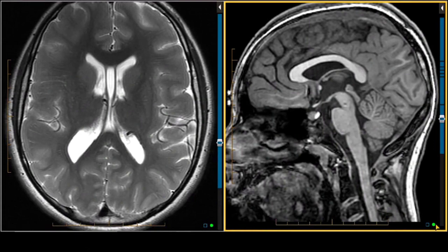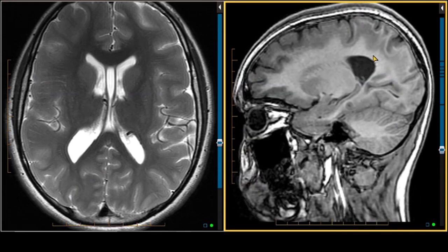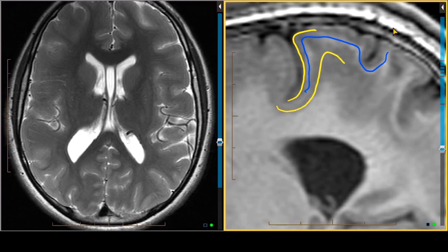This is an MRI of the brain in a child with developmental delay. If we look on the T2-weighted imaging, we're seeing ill-defined gray-white differentiation posteriorly in the occipital lobes. If I go to the sagittal T1-weighted image, I actually get a little better delineation. I see the cortex at the periphery. Intervening is an area of white matter. The myelinated white matter looks bright on T1-weighted imaging. And then following that, beneath the surface, I'm seeing an additional area of gray matter-like signal.